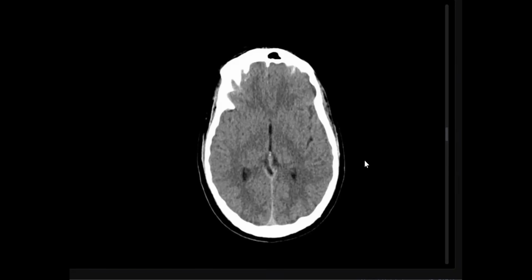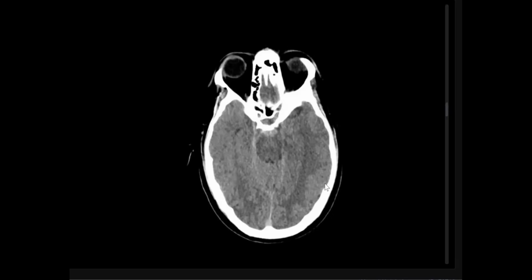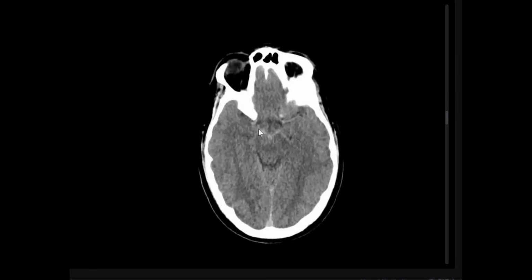The perimesencephalic cistern. Look at it. Where is the interpeduncular cistern? This is a young patient, so I should see the density of CSF. Yes, you see. Okay, describe it, my friend.